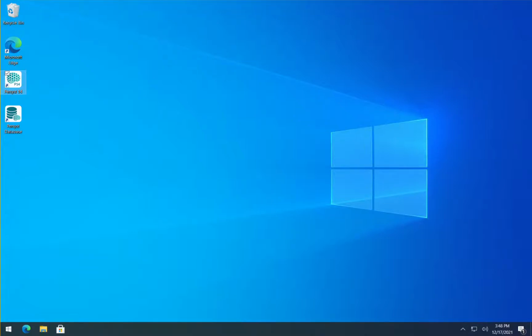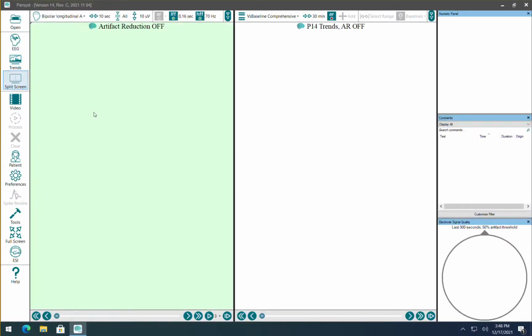This screencast will go through the process of back averaging in Persyst. My name is Michael Guest, VP of Research and Clinical Applications for Persyst Development Corporation. Let's go ahead and launch Persyst 14.